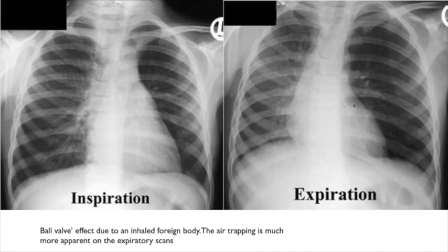In the majority of cases, the X-ray is negative at the beginning. So what happens in this case? You have to admit the patient in the emergency room and follow the patient with chest X-ray. What kind of chest X-ray? You ask the technician to do one X-ray in inspiration and another in expiration.